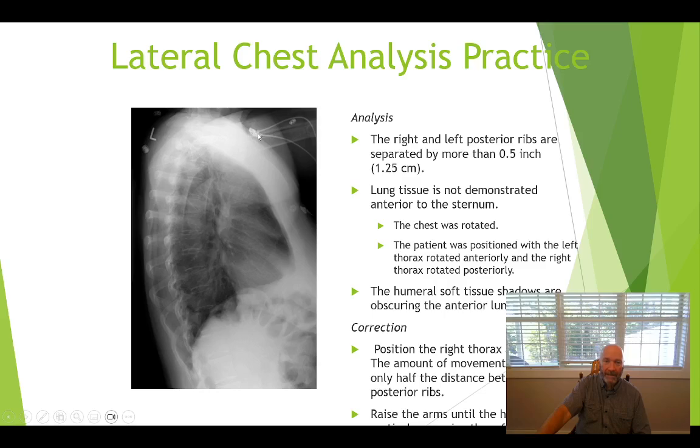So what we see on this patient is telemetry leads. Maybe this is as high as the patient can get the arms up and out of the way. This may be a really, really sick patient, so this may be as good as this patient could get. So what is it that they're looking for? How tough was the patient? How hard was it to get the patient into this position? And all of those things should go into your decision whether or not to repeat an exam.